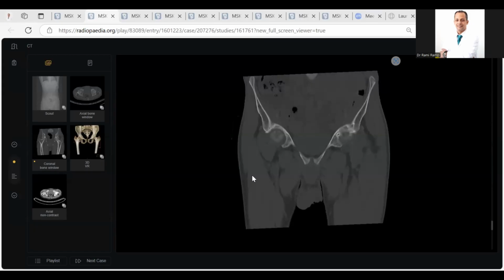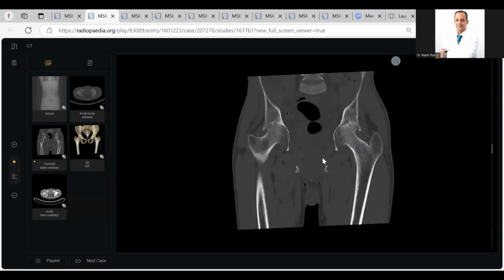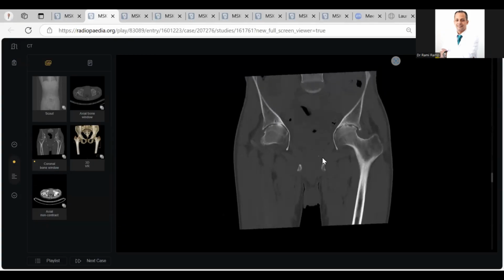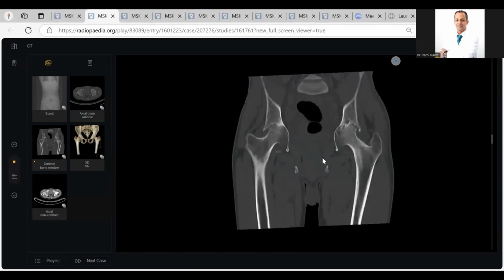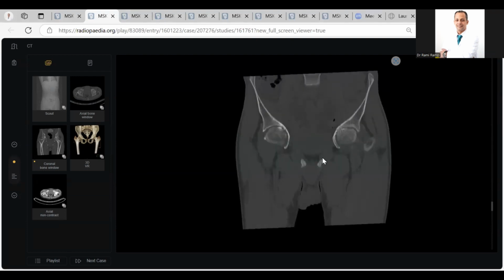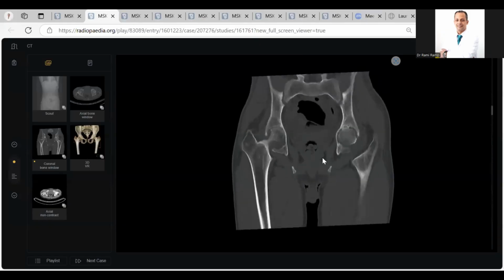with Dr. Akila. What's your differential diagnosis? The top differential was stage 4 avascular necrosis of the left side, and the differential would also include inflammatory arthropathy, which would usually present like rheumatoid arthritis.